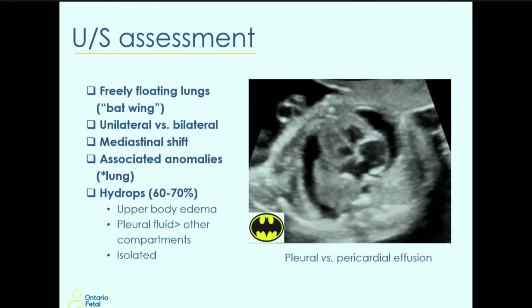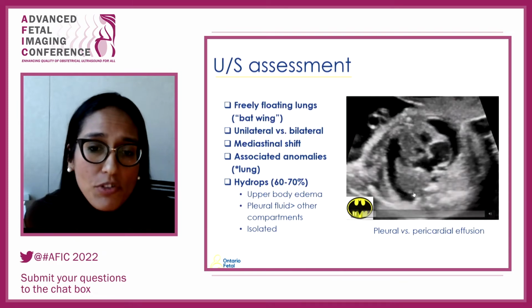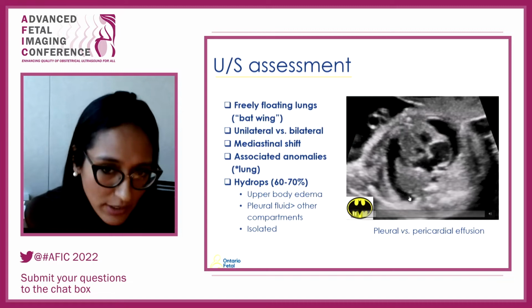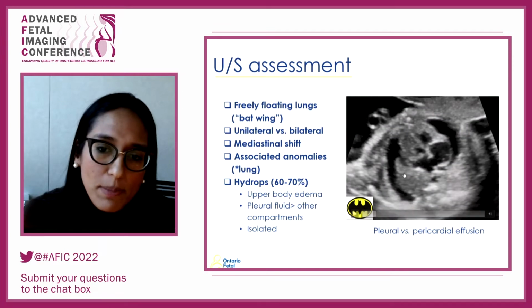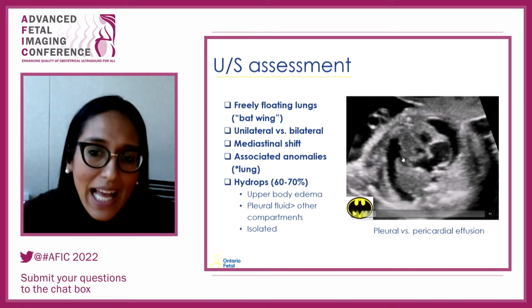Pleural effusions are not uncommon in the prenatal world. To distinguish pleural effusions, we have to recognize the difference from pericardial effusions. On the left of the screen, you have a pleural effusion, which is floating freely in the fluid. The video was playing for a sec there, but it should be floating freely in the fluid like a bat wing, and that's a pleural effusion.